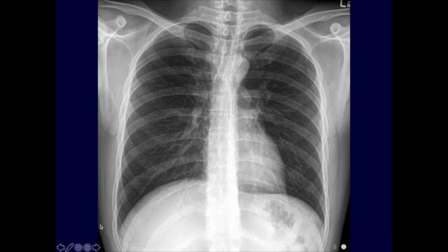So for example, you have subcutaneous fatty tissue that you see part of here that's darker than the adjacent soft tissues. You also see between the musculature planes fatty tissue here that is relatively darker. And again, this is a normal chest x-ray. Another location where you commonly will see fat normally is up here in the neck. This is important to know because when you have pneumomediastinum or air in the mediastinum, it can track up into the neck, and gas in the neck soft tissues is often a sign for pneumomediastinum. For inexperienced readers, they might look at the fat here and wonder if it's gas. So remember what this normally looks like.